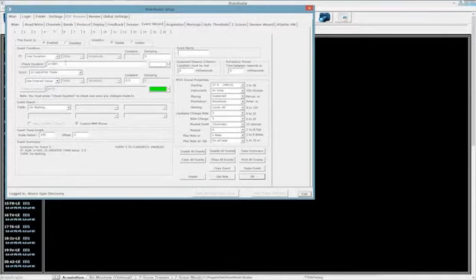All right? Now, that would explain why I have a 0.5 right here. We're saying that I need this event to be greater than this number. And if that's true, I'm actually controlling the MMP player. And for those of you who are not wise to this, event 5 is also where we control our Flash player. So this is going to control 2 big things. So what's going on in event 6 is probably very important. So let's go to event 6 and figure out what's going on.